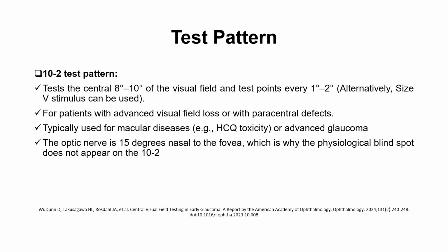It's noteworthy to mention that, as we said, the optic nerve is 15 degrees nasal to the fovea, so this is why the physiological blind spot doesn't appear on the 10-2 test pattern.